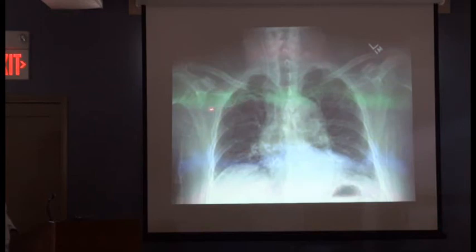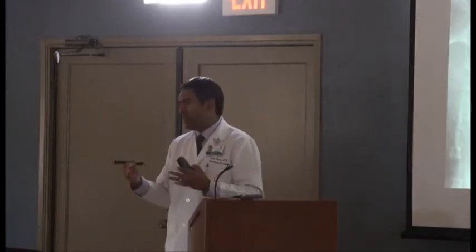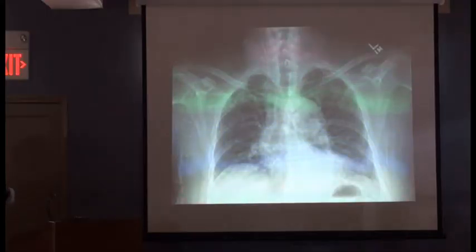That's exactly right. So you can see the central line is the subclavian. It should be going down in the SVC into the heart, right? Look at it going up. All right, so that's an E, everything else. That's just another kind of ICU-related chest film.